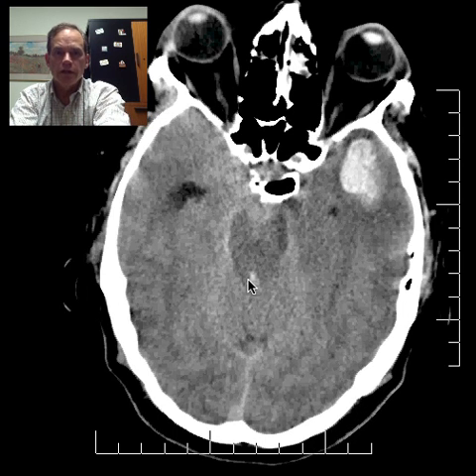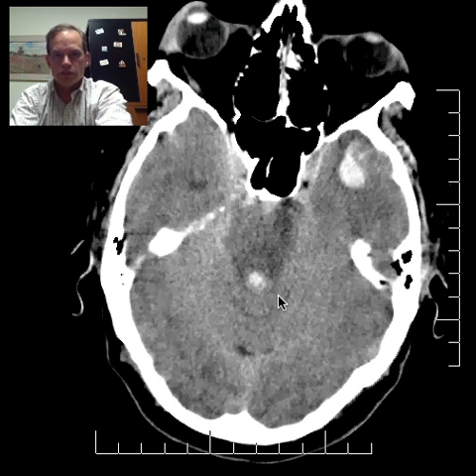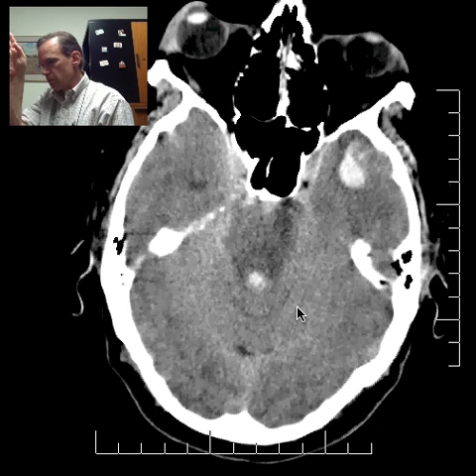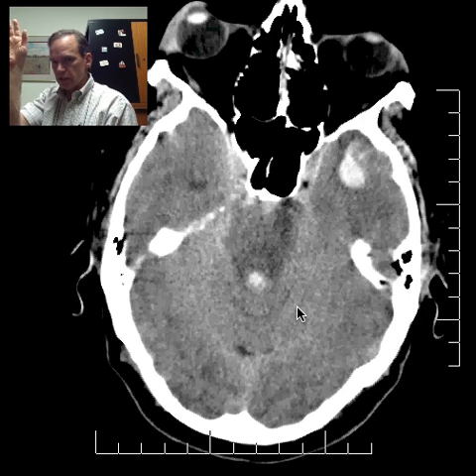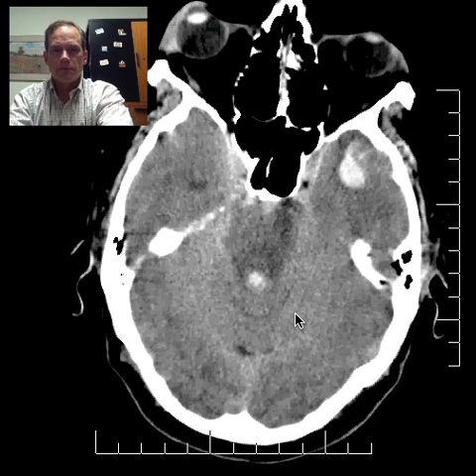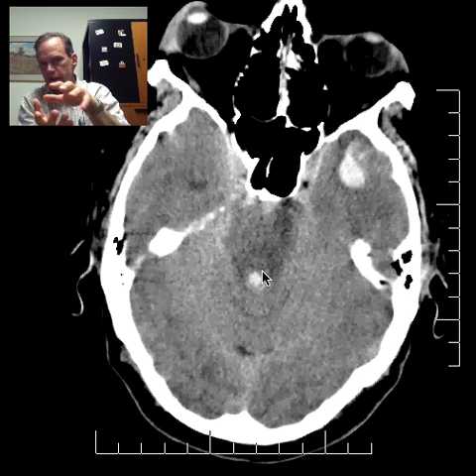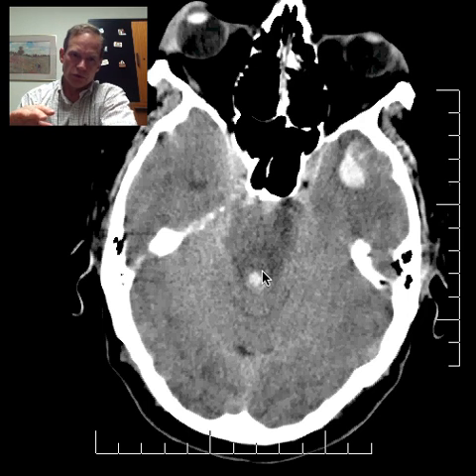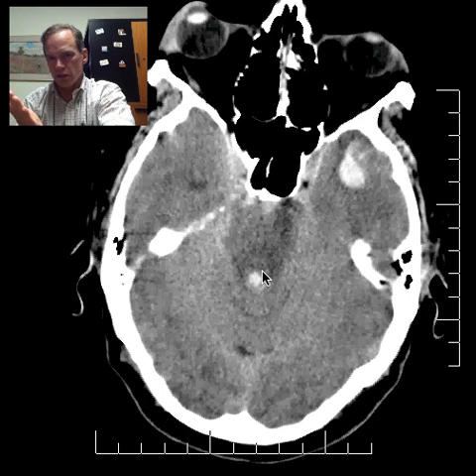And go down a little inferiorly. And here we are in the cerebral aqueduct, and it should be opening up, and indeed it is, to the fourth ventricle, immediately caudal to that. Remember, rostral is upward and toward the top of the brain, and caudal is downward, and those are terms. You can still use superior and inferior, and I do when it's within an area of the brain. But I would describe the brainstem not so much as inferior to the cerebral hemispheres, but caudal, because it specifically alludes to that axis from the hemispheres to the brainstem.